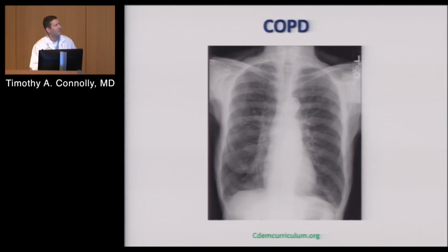I put this x-ray here because this is a huge pet peeve of mine. As someone who takes care of a lot of COPD patients, radiologists will look at this film and immediately say, COPD. Now, in fairness, I agree. Those lungs appear hyperinflated. But I don't know that that isn't just somebody who is 7 foot tall and really thin. We see that. So you can say, and I never have a problem if you say your x-ray shows hyperinflation, there's a question that that might be some COPD. You need to have it tested. But you cannot say that someone has COPD without doing lung function tests. It's the only way to make the diagnosis.